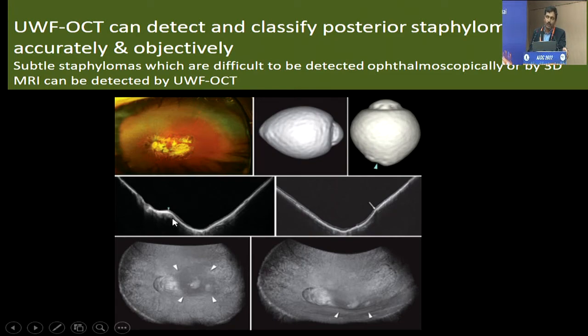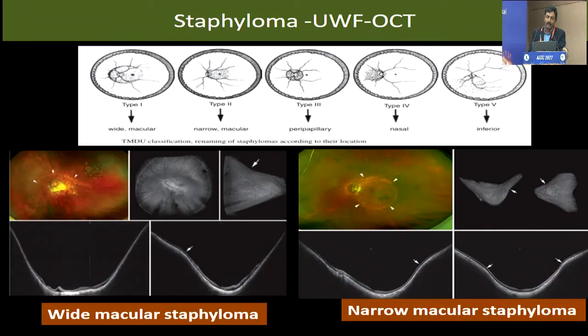So you should use multimodal imaging techniques rather than a single technique. Staphylomas have been classified in various ways. There used to be the Curtin's old classification.